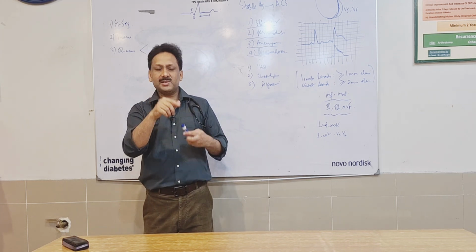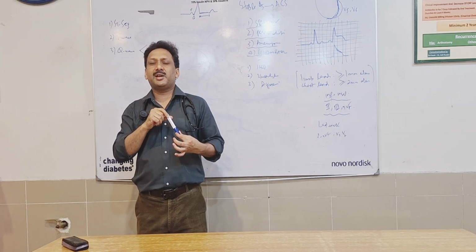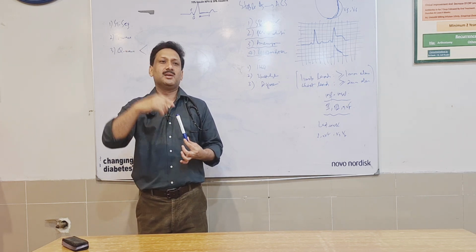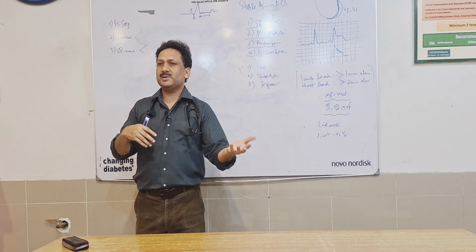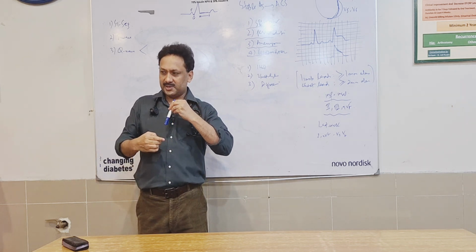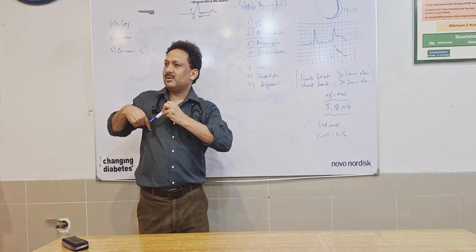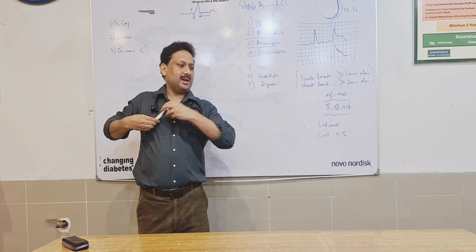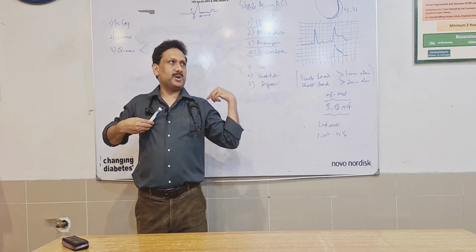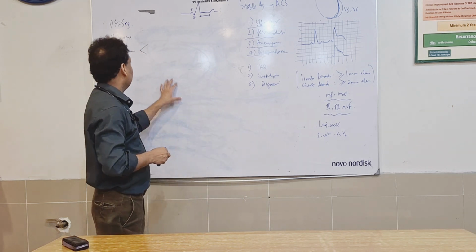So the point was that if something is towards the cardiac axis direction, everything will be above the baseline. Something exactly opposite to that is below the baseline. If the axis changes, then the lead in this direction will show positive deflection, like this is lead number 3, and the lead in this direction, which is AVL, would show a downward deflection, right? So remember this point as well.